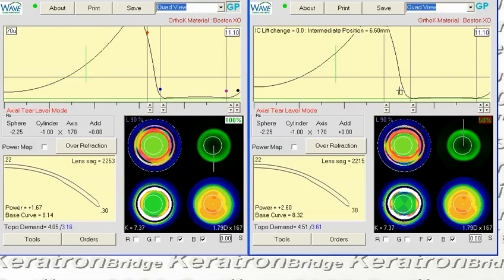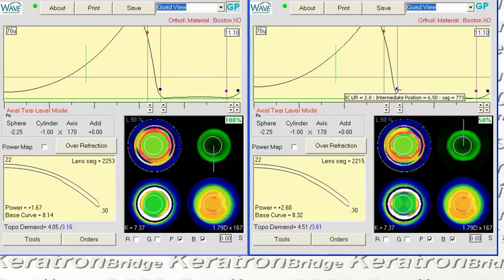And 6.5. Okay. By bringing the zone in, you can see that we've already overshot the amount of extra power that we wanted to generate in that meridian. So in this case, this is why with 3/4 diopter of residual cylinder, I normally wouldn't do an oval zone. It normally wouldn't call for it, but in this case, we're going to try it.